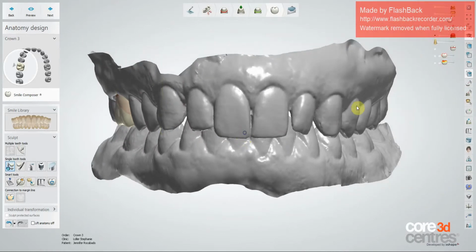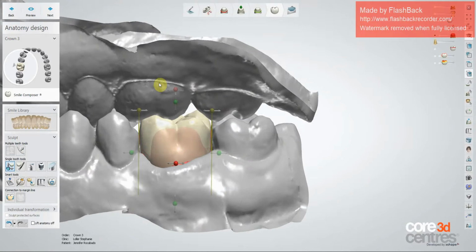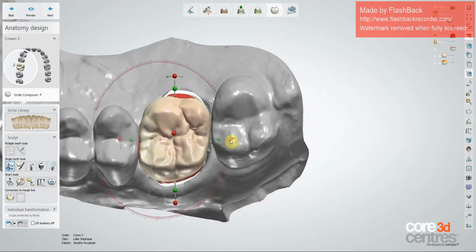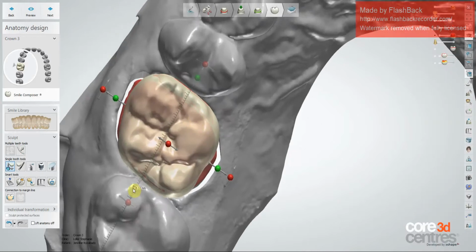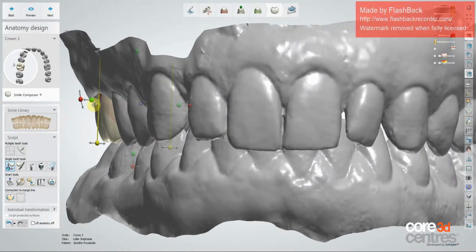I'm placing, I'm looking over here, working some more. Before I set my margins, 90% of my work is already done. 90% of my design is designed.